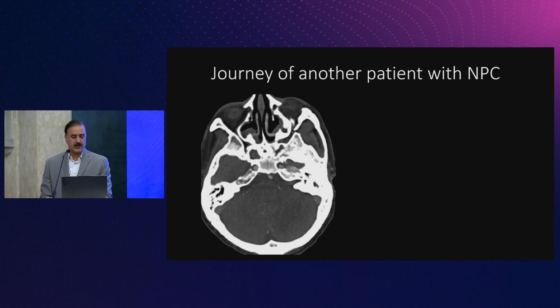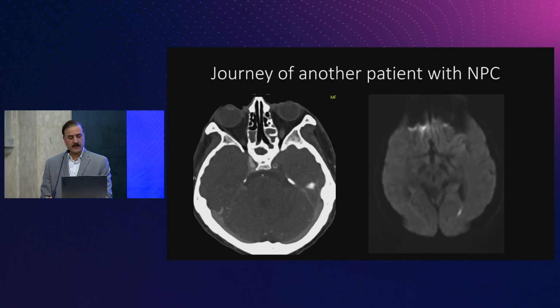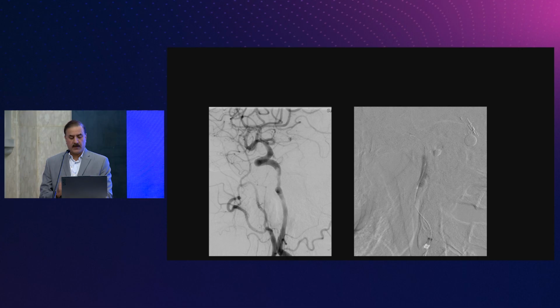There's an intraluminal clot there, and you can see the lumen of the carotid artery on that side. The patient had developed these multiple embolic infarcts on that side. The patient was taken for clot retrieval, and you can see that very ragged-looking cervical internal carotid artery.